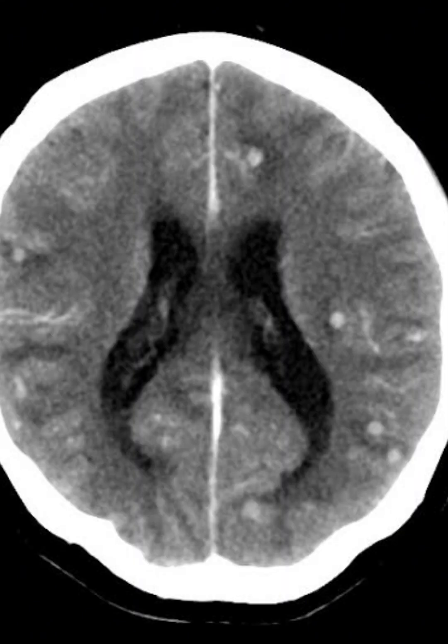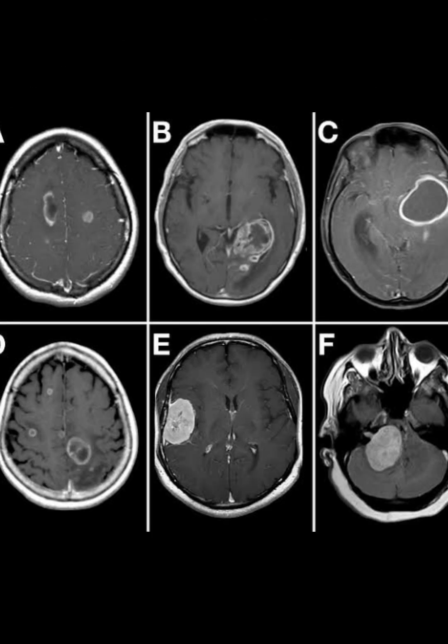Now these are the tuberculomas. They usually occur in tuberculous meningitis. You can see the white spots everywhere in this CT brain. So these are the tuberculomas. Now this is the last CT which is showing intracranial brain tumors of different types. Some are white in color, some have got ring enhancement.